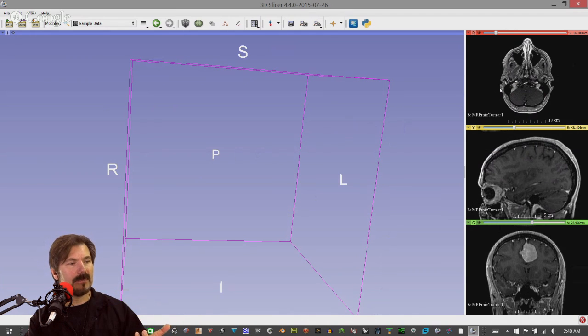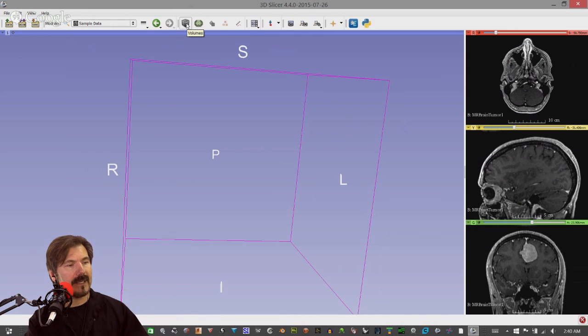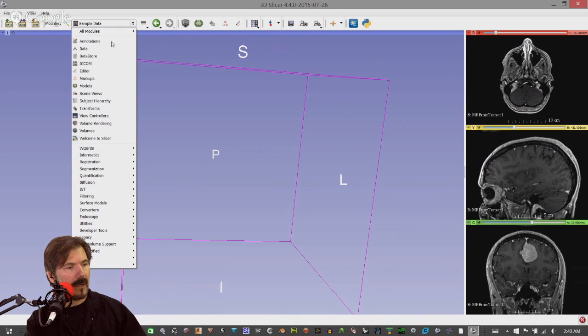So seeing is probably a better way to understand this. So I'm going to immediately go into creating one. And you do this by pulling down this little main menu here, clicking on volume. Now the other strength behind this is it actually is also here, if I remember correctly. This is volumes, models. Actually, they don't show it here. I could actually pull that icon over here so it could be on my main menu bar as well.